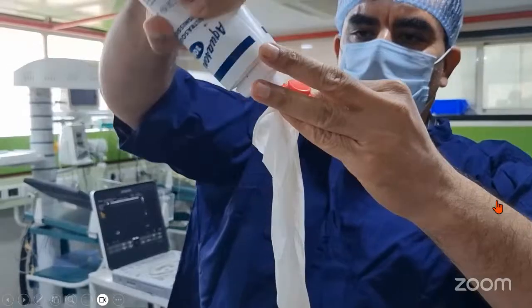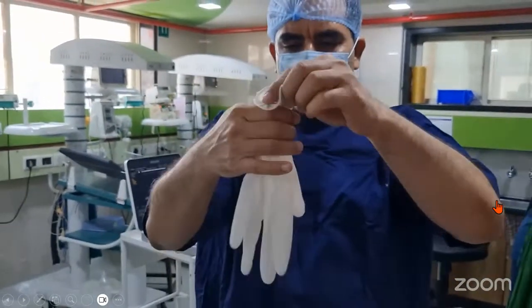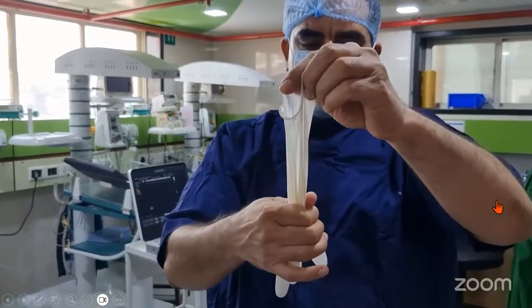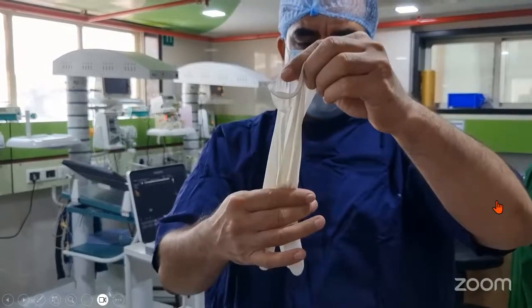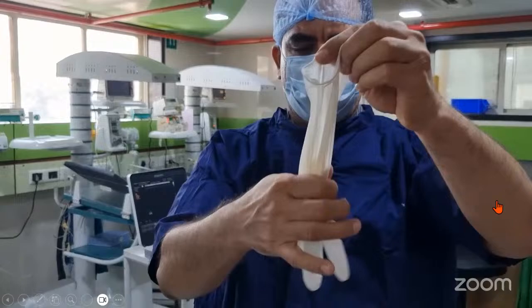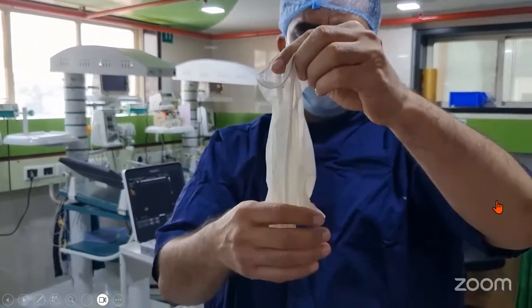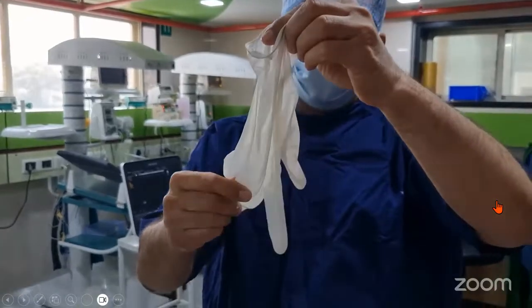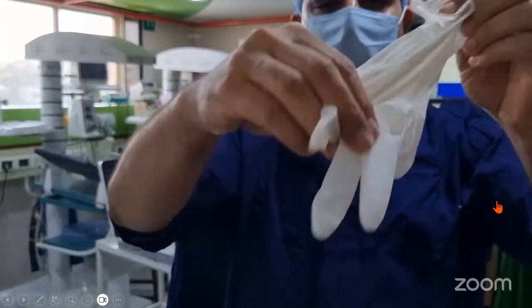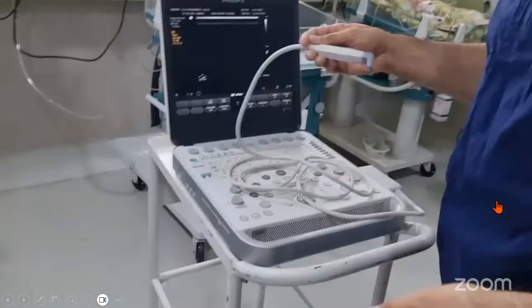So here I'm showing it in the sterile glove, but after doing the surgical scrubbing, cleaning and washing of your hands, you take the sterile glove and put this sterile jelly into it, concentrated into one or two fingers of the glove, and then you can insert the probe into this. So that becomes the medium, and your field will become sterile.